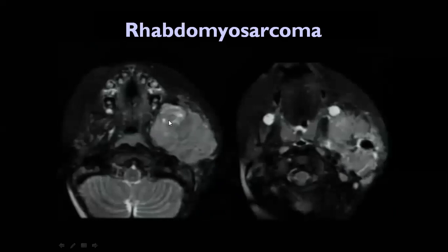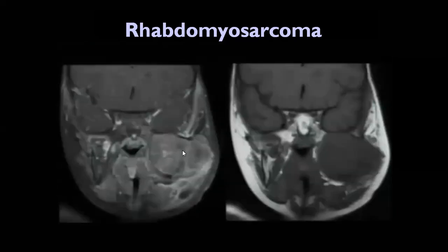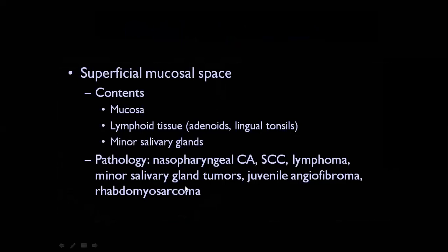space, also rhabdomyosarcoma, especially if this patient is young. One of the good differentials, rhabdomyosarcoma, especially if the patient is young. Yes, rhabdomyosarcoma again, and you can put anything else. Okay.